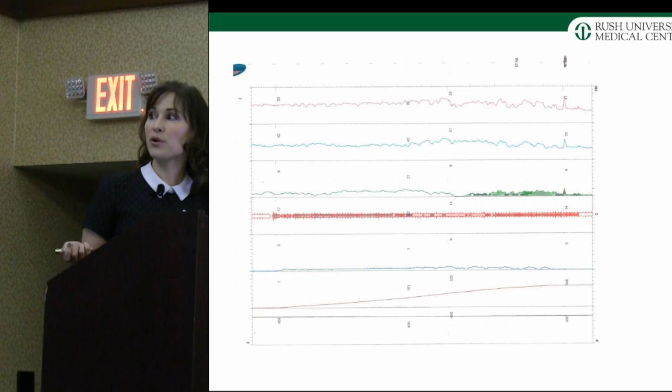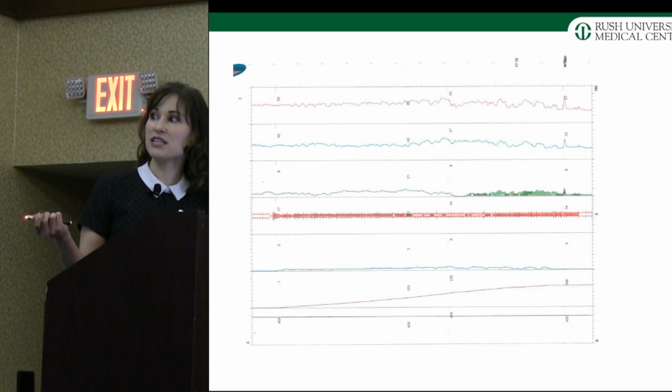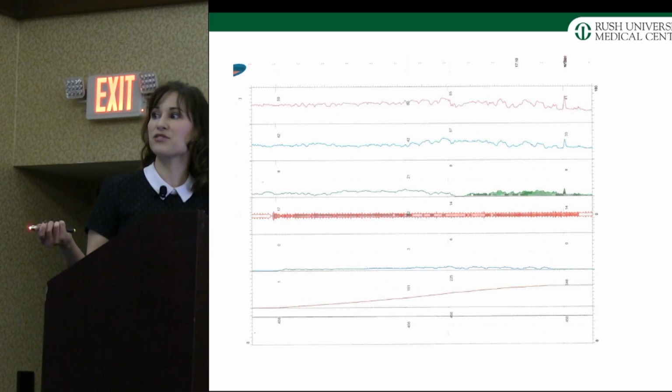This is another example of a patient who was given permission to void. Nothing was happening, nothing was happening. They're using their abdominals a little bit here, but you can see these pressures are really low. This is the detrusor pressure. These are low. And you get a little bit of a flow here. It's prolonged, intermittent, interrupted flow there.